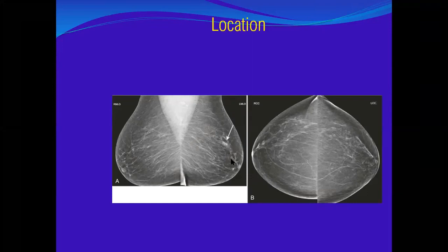This is the post-breast CC and mediolateral oblique view. On the left mediolateral oblique, there is an area of asymmetry. Yes, so this is an asymmetry. Tell me, are you confident to label it as asymmetry, or might it be a focal asymmetry? This is my question. It might be a focal asymmetry. Why? How can you prove it? Why is it not seen in the CC view?